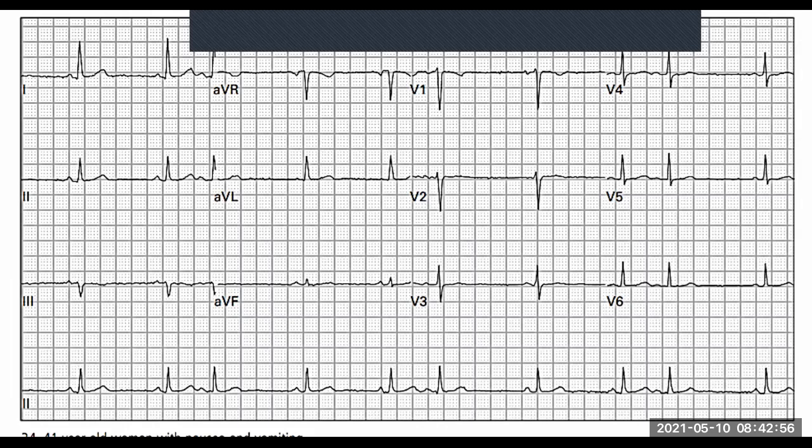Okay, so any idea what could be happening, or what in ECG terms, and even to the people on Zoom, ECG terms, what would we say is going on over here? Because what we've got is generally a normal rhythm with these interspersed extra, let's put it like that, extra contractions. So what's happening? We've got an atrium and ventricle that are functioning, but every so often, the atrium kind of kicks in, just like it does here. It kicks in, and then you get another beat in between. So what's that atrium doing?